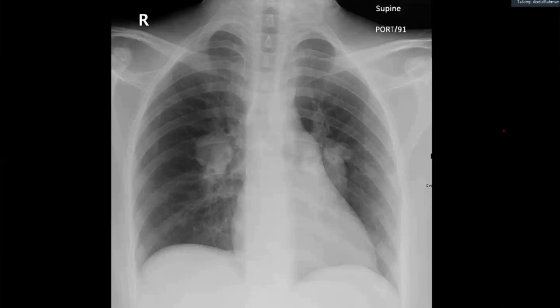Okay. Otherwise called what? Pulmonary arterial hypertension. But I cannot see pruning of the vascularity, or I'm not able to figure that out. Okay. Ignore the left hemithorax. Just focus on this. What did you call this? Prominent pulmonary arteries, right? What does prominent pulmonary artery mean? An enlarged pulmonary artery, right? Yeah. So what's an enlarged pulmonary artery called?